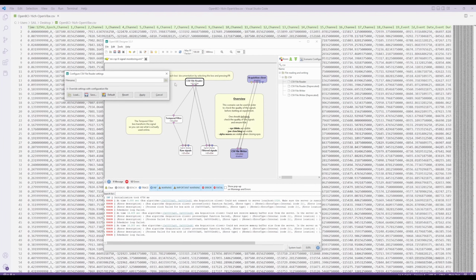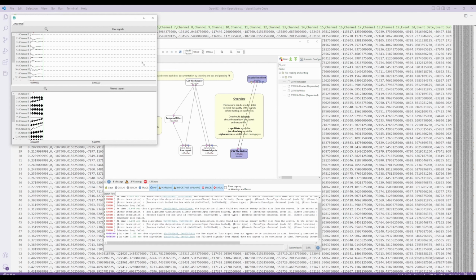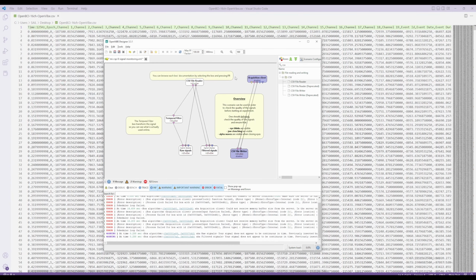And if we point it at our file, we should be able to play it back. There we go. With no problem, and also fast forward through it, this button here. And so this shows that this is how OpenVibe prefers to read and write CSV files.